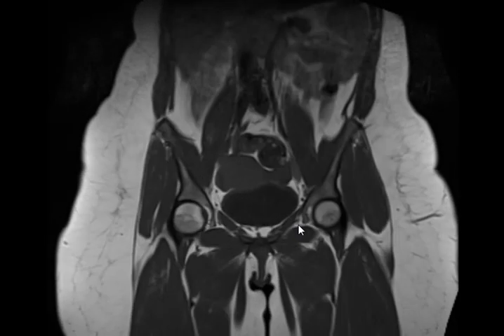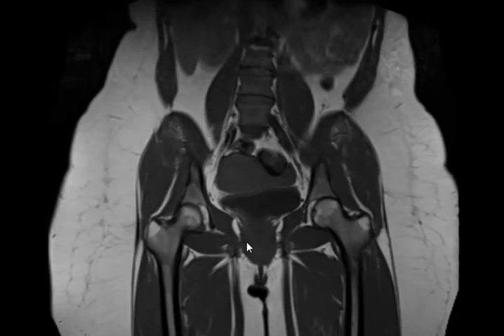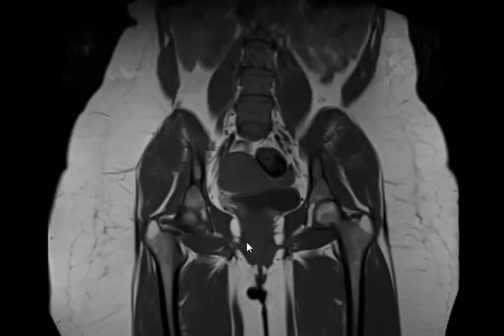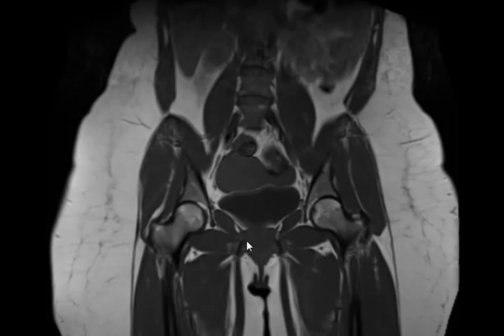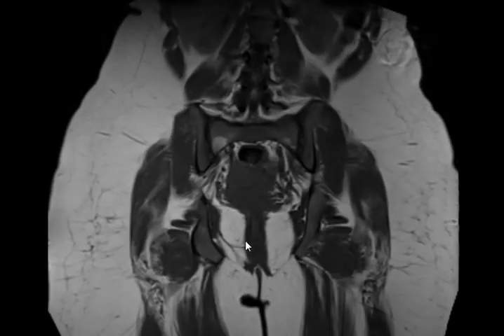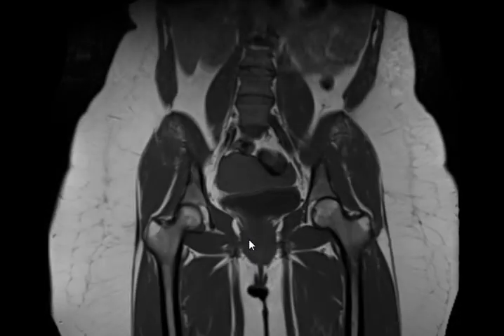Especially in the sacroiliac joint, you say high signal intensity involving the iliac aspect of the right sacroiliac joint, or the iliac aspect of the sacroiliac joint bilaterally, or both iliac and sacral aspects of the right SI joint or left SI joint or both SI joints. So you have to decide which aspect and whether it's symmetrical or asymmetrical, bilateral or unilateral. So start from the beginning.